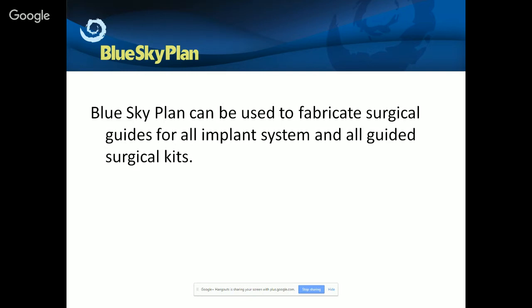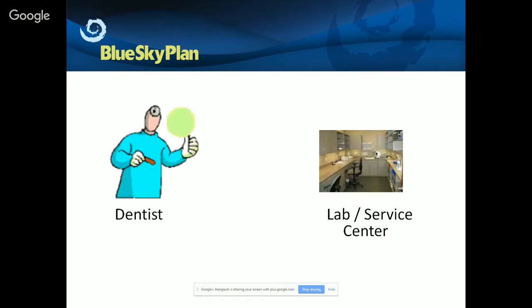When the surgical guide is done and you're ready to export it, then there is a small low per case fee just for the export of an STL file, and then you could send it to a 3D printer. The process flows that we're going to be discussing is very similar if you're a dentist or if you're a lab or a service center.